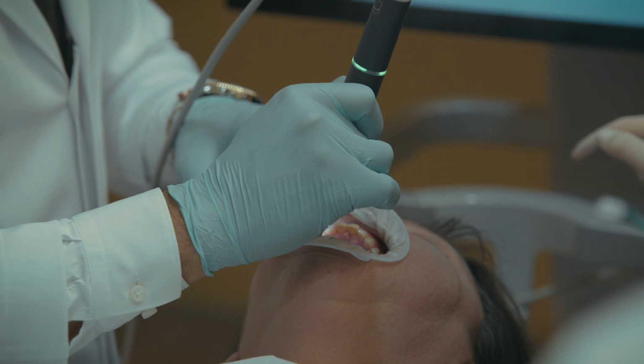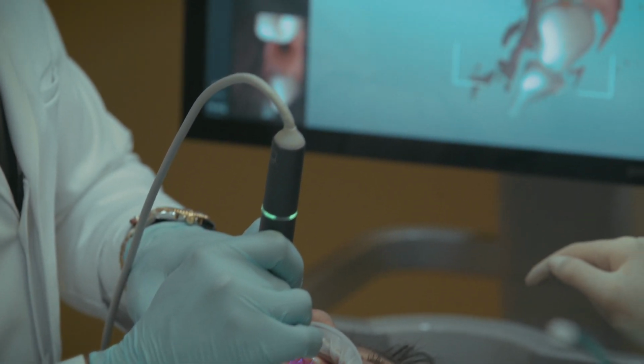Hi, I'm Hugo Madeira, and in this video I will talk about prosthetic design and chairside milling in our daily workflow. Now, you might wonder, why should we use the digital workflow? Well, if you already have an intraoral scanner or you are thinking about having one, you have to make the most of it. Why? Digital dental technology is entering into a mainstream stage of adoption and is used by approximately 34% of clinicians. Digital scanning devices are rapidly developing in many fields of dentistry.